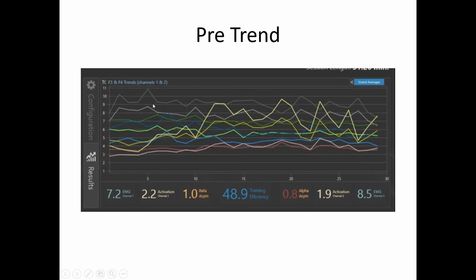So if you see where the 2 deltas are far apart, the 2 thetas are far apart, the 2 alphas are far apart, that's off. That's not how the brain's supposed to look. That's not going to show up in a normal map. You can look at it. It looks disorganized. It looks disorderly. Clean your area, soldier. Make your bed. And then we have this high beta blasting all around as this person's showing all this muscle tension and beta harmonic activity because they're not comfortable in their body and they're bracing because they have complex trauma, waiting for the next shoe to drop. They're trained to live that way.